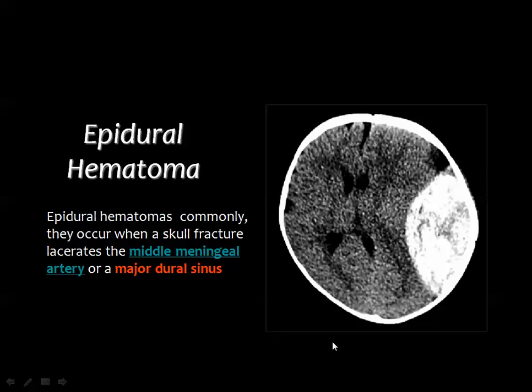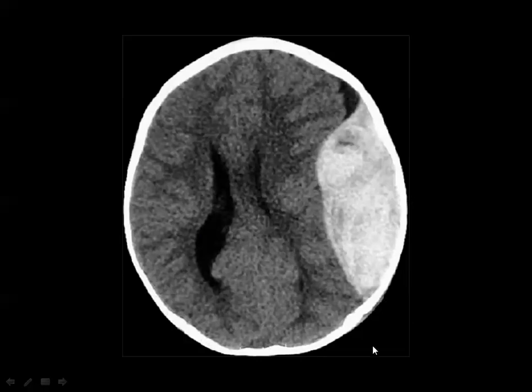This is a big epidural hematoma on the left side, having a typical appearance, hyperdensity related to the inner table of the calvarium with convex inner margin, and you see the significant mass effect on the ventricles. And this is also a good example of epidural hematoma on the left side with convex inner margin and compression of the left lateral ventricle with dilatation of the right lateral ventricle secondary to kink of its foramen of Monro.